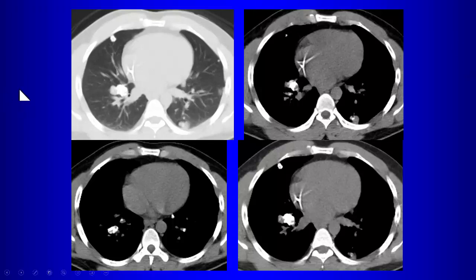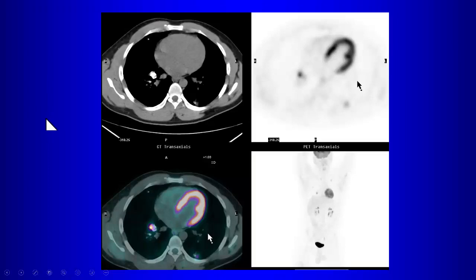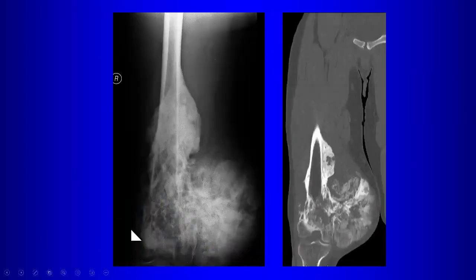But for this particular case, this patient also has this study, which is what? It's a PET scan, and it shows a metabolic nodule on the right. So what are we thinking about now? Well, first of all, could this still be granulomatous disease? Yes. You can have active granulomatous disease that gives you activity on PET scan. Anything else you might consider? Mets from what? Yeah, so calcifying metastases, especially tumors like osteosarcoma and chondrosarcoma, which was the case here.